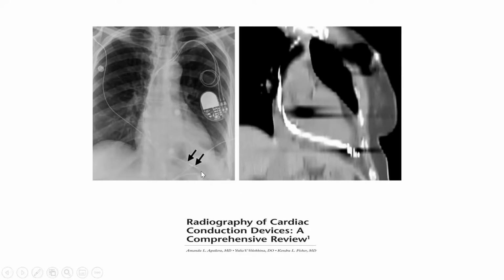If we consider this is the gastric gas, this is somewhere below the cardiac borders. But I think in this case the X-ray might be deceptive. Sometimes by the X-ray, from my own experience, you might feel that the lead is beyond the boundaries of the heart, but it is not.